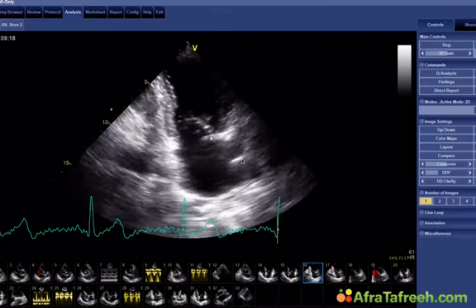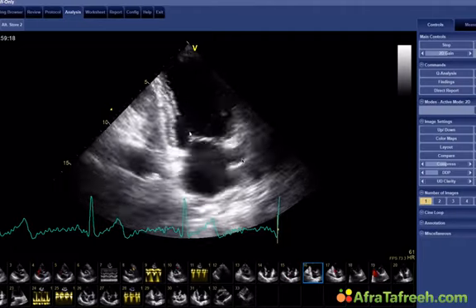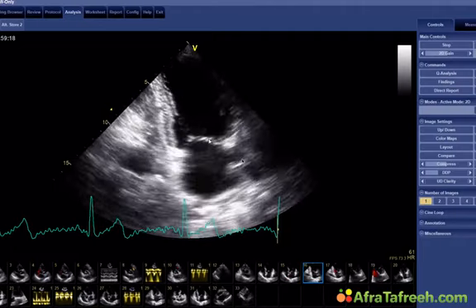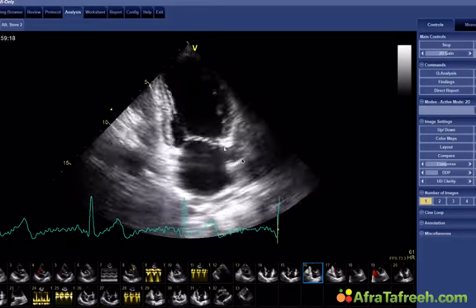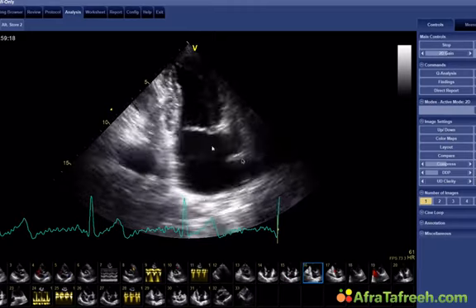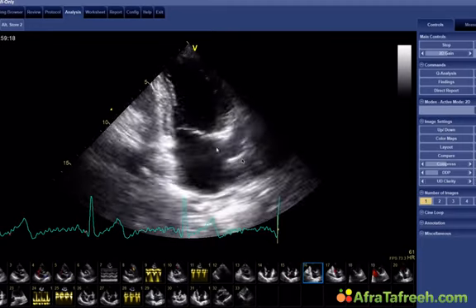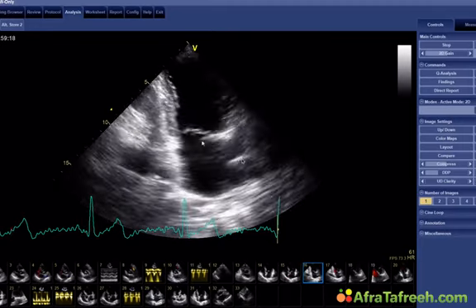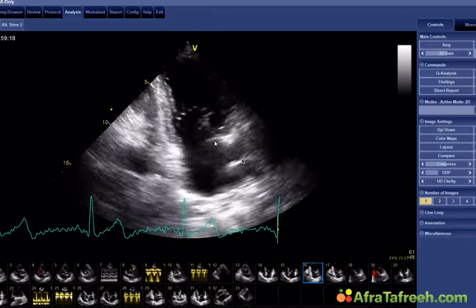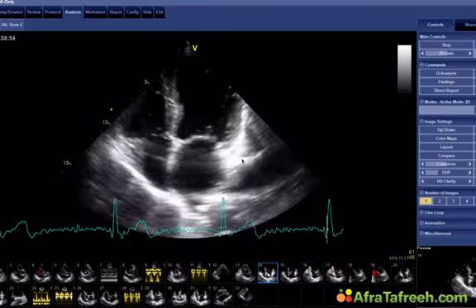Now you cannot say if you have a defect of the anterior or the posterior leaflet here. The only thing you can say is if you are more in the anterolateral or in the posterior medial regions. And even on the 2D image, you can appreciate that there is something going on here, that there is some kind of defect located right here. Now, there's also other ways of looking at this.